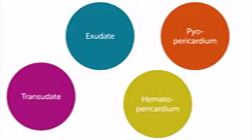But by looking at the echocardiogram, you can get at least some hint as to what the cause of the effusion could be, especially if you can pinpoint the pericardial effusion as being a transudate, where you have a very clear fluid within the pericardial sac, an exudate, where maybe fibrin strands are present, a pus-filled pericardium where you have consolidated parts, as we saw previously in the patient with the pericarditis, or a hematopericardium, where I showed you an example as well. So you see, knowing what the cause of the pericardial effusion is definitely helps you to decide whether or not a pericardial effusion matters.